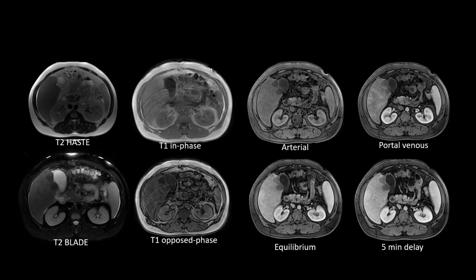When we obtained an MRI at our institution, we can see that these are near iso-intense on our T2 weighted imaging without FAT-SAT. They become hypo-intense to the background steatotic liver with T2 fat saturated imaging. On our in phase and opposed phase, there is loss of signal on the opposed phase relative to the in phase. And these masses are relatively hypoenhancing.